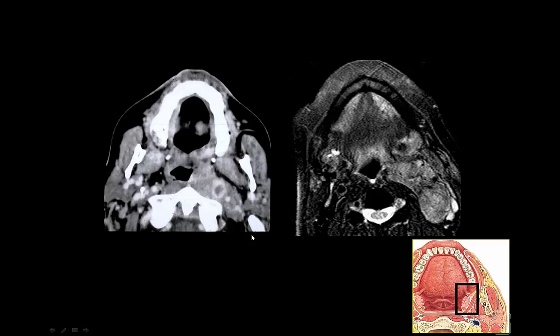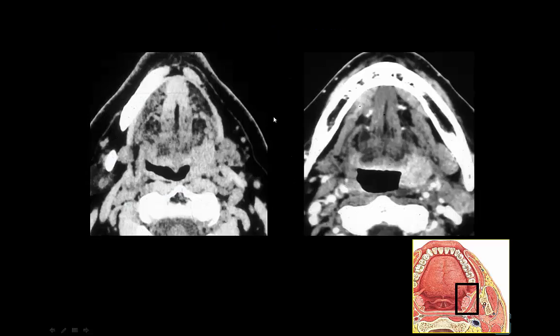Now, as I mentioned before, we have to understand the normal constituent anatomy or the composition of the anatomy. So what do you think would be the second most likely diagnosis? It's not squamous cell carcinoma, so what would be number 2? Lymphoma, exactly right. And now we know it's lymphoma. Why? Because the palatine or the faucial tonsil contains lymphoid tissue. So naturally, number 2 would be lymphoma. A nice example here of enlarged, if you will, blandish lymph nodes, and there is a metastatic, or involved, I should say, retropharyngeal lymph node from lymphoma.